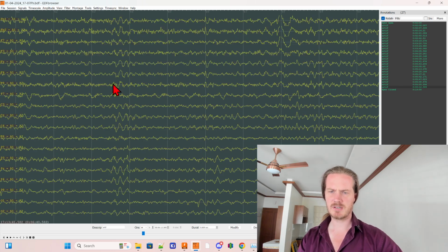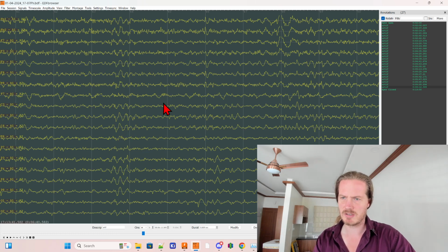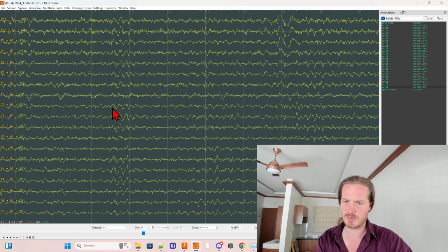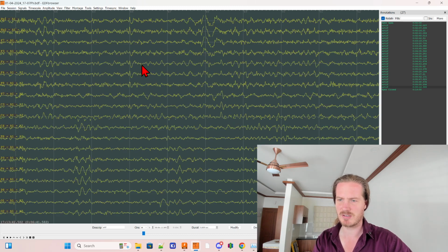See here again, if you only looked at the front, you might think it's an eye blink. However, it goes all the way through the whole brain. So this to me doesn't look like an eye blink, but more like some sleepiness. Based on the frequency, you see it's much slower than alpha. There would be like 5 or maybe 6 of them in 1 second, so that's more sleepiness.